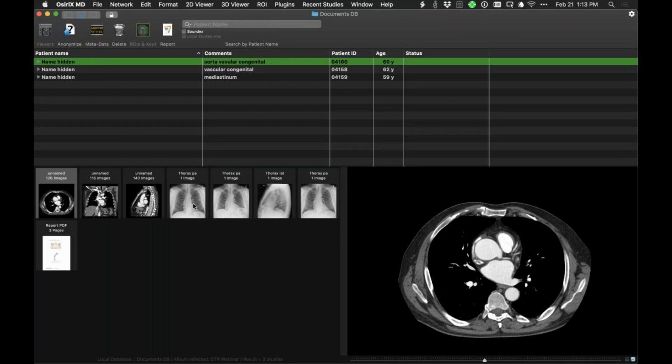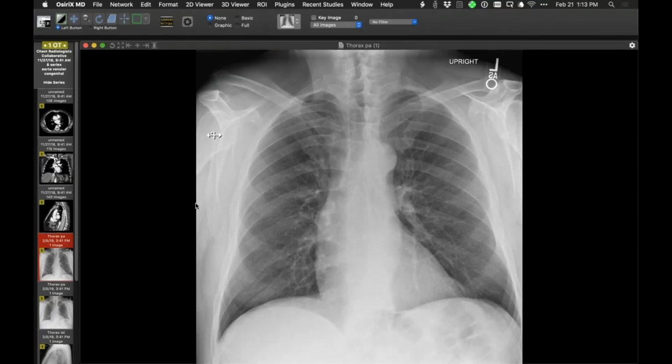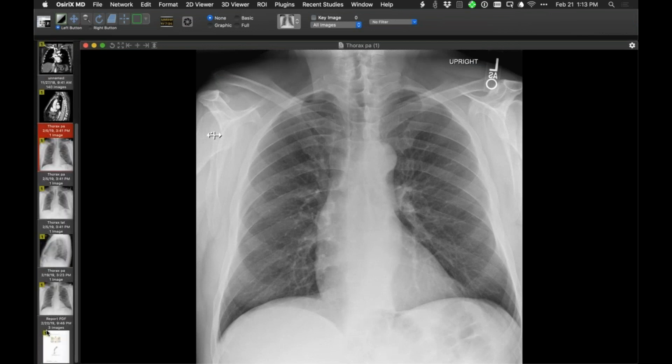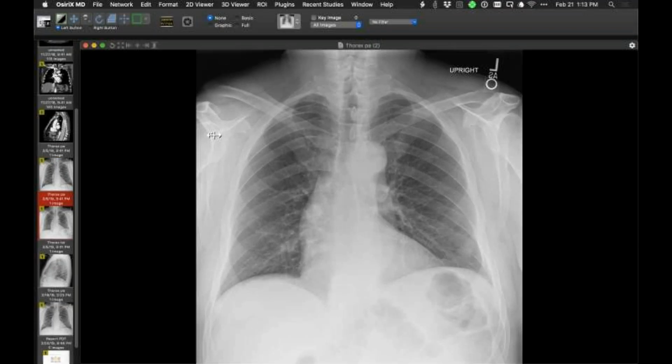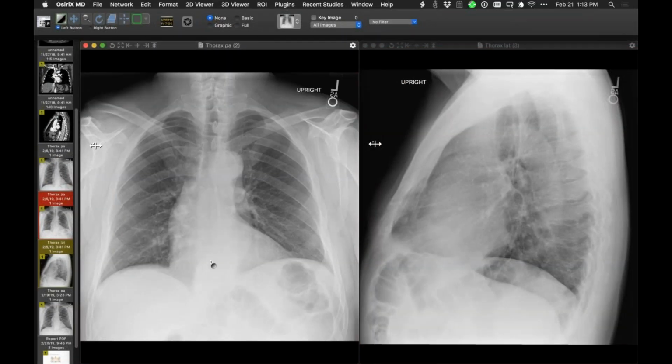Sorry, yep, let me just get this one up. Of a patient that, depending on when you image these patients, they may be going to surgery. But if you have someone that is a male, and shortness of breath, and particularly if there's a murmur, diminished exercise capacity, I'll bring up the lateral. There's one particular finding here that goes along with the association between aortic valvular disease, and that is a rather dilated ascending aorta.